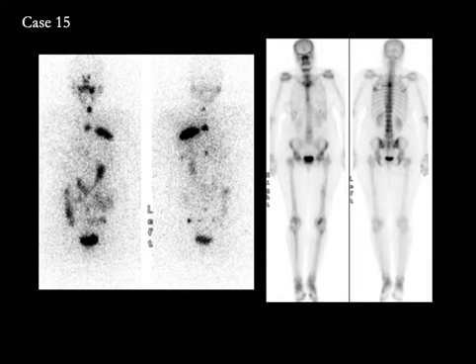Case number 15 shows I-131 whole body scans in a patient with bone metastases. They are best seen as the focus here involving one of the vertebral bodies and a linear focus involving one of the posterior ribs on the left. The interesting finding here is the correlation between the I-131 scan and the whole body bone scan, which is seen on the right. The focus in the vertebral body shows increased uptake of MDP, but the focus in the ribs shows a photopenic area, and we know that thyroid cancer bone metastases are lytic metastases, and so they will take up I-131 but may not take up technetium-99m MDP.